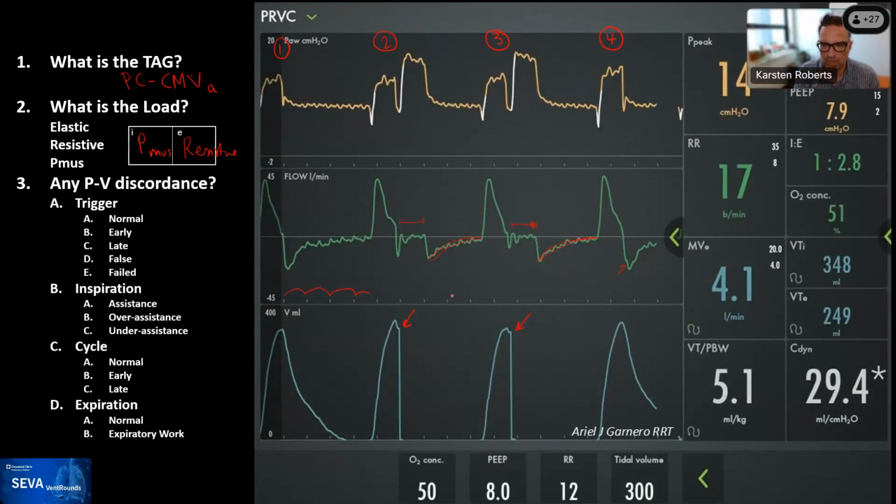And I think it's a good question to ask, why is there some sort of inspiratory pause observed? I think that both Ari and Sarah are on to the fact that there is zero flow happening during that portion of the breath for a particular reason. Eduardo, should we move on to the patient ventilator discordances before we address that?